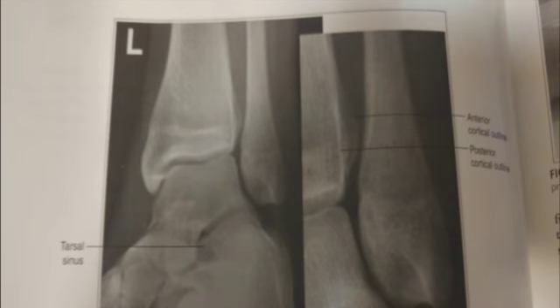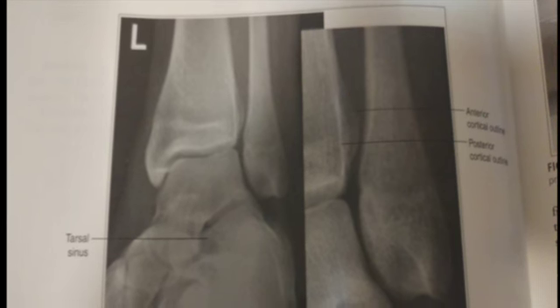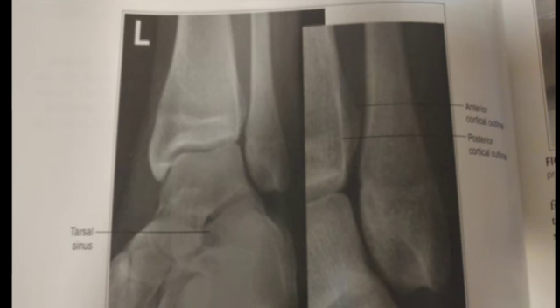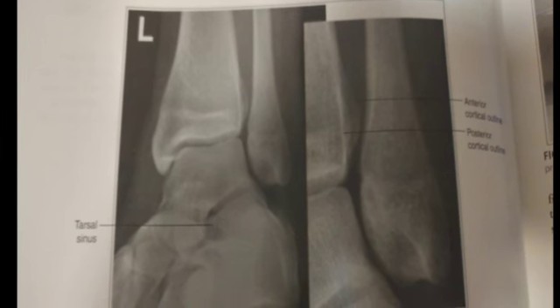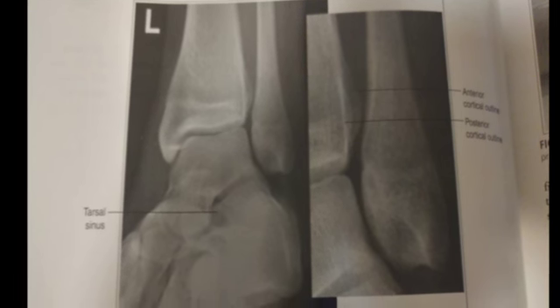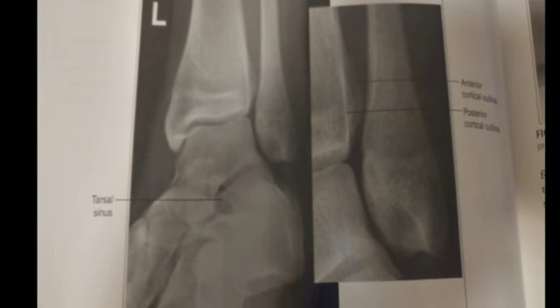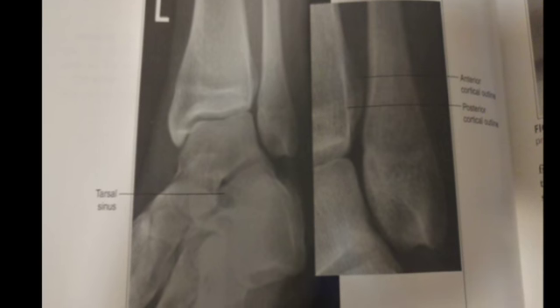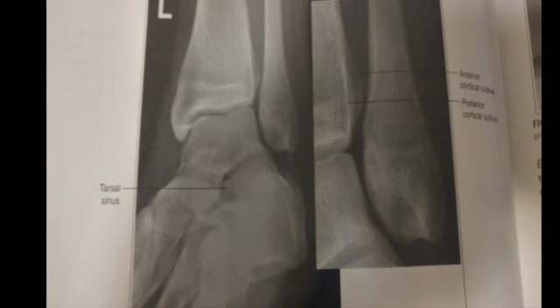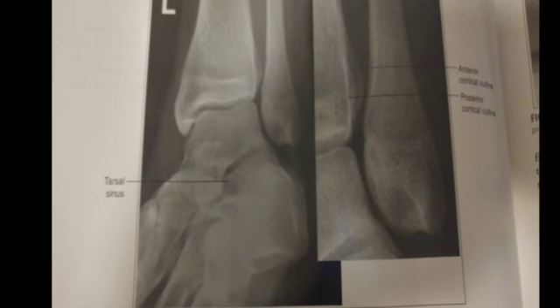So we will compare that with the accurately positioned radiograph. Let's see how our radiograph of the ankle oblique view differs from the correctly positioned view. The evaluation criteria states that a 45-degree medial oblique demonstrates the tibiotalar joint open with no or only minimal overlap on the average person. But as we see in this view, it's partially superimposed.